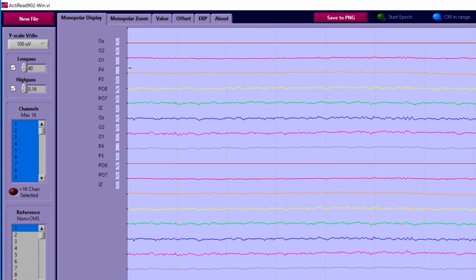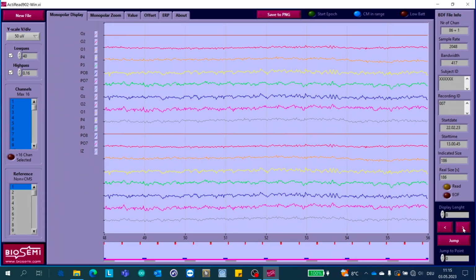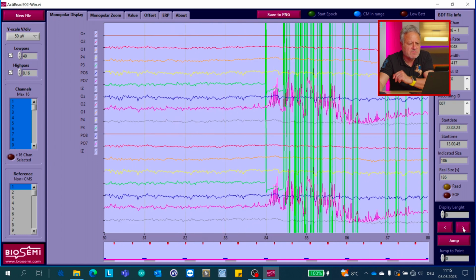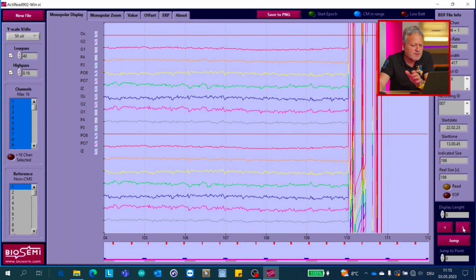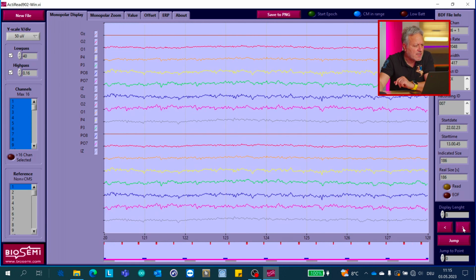So here goes the EEG. We can do a bit of a better sensitivity level. So here's the EEG going through of Joanna. We had some movement artifacts here, definitely, so don't worry about these. Here she was doing something else. So here's the EEG. That's all good.